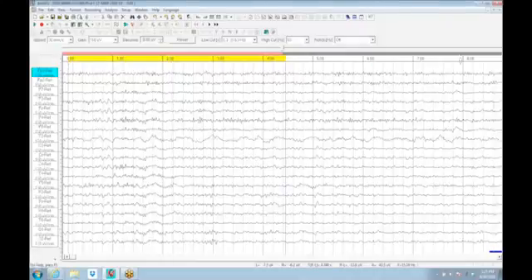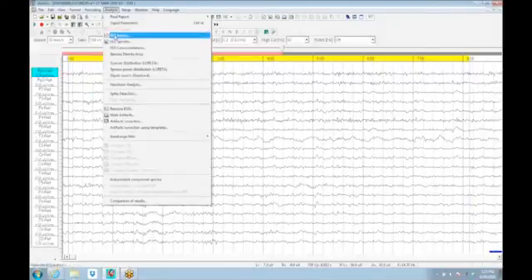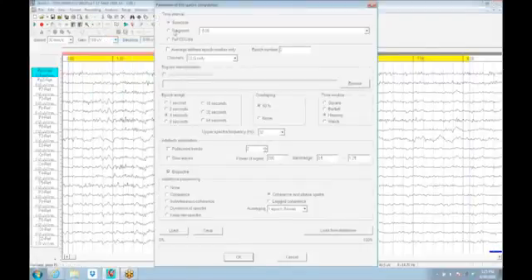But once I have the piece selected, I can end up analyzing that piece, or the fragment if it's predefined, or a full EEG. Everything other than the pieces I have set aside with the blue underlining will now be analyzed.